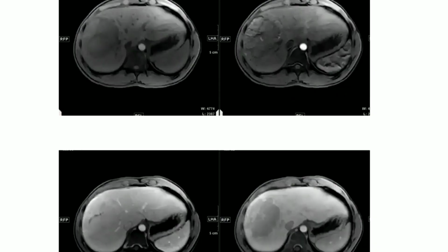So just to confirm, because this is a very important point, FNH typically is homogeneous hypervascular. Central scar typically enhances in the delayed phase, not necessarily. Iso on T1 and T2, slightly bright on diffusion. It is homogeneous hypervascular, fading away in the delayed phase.